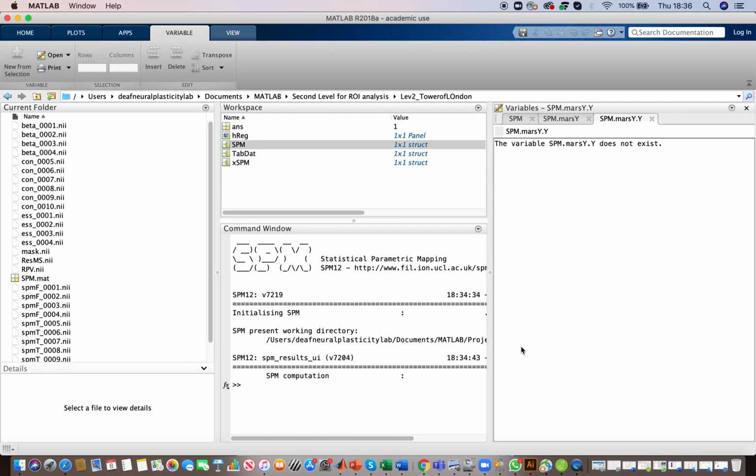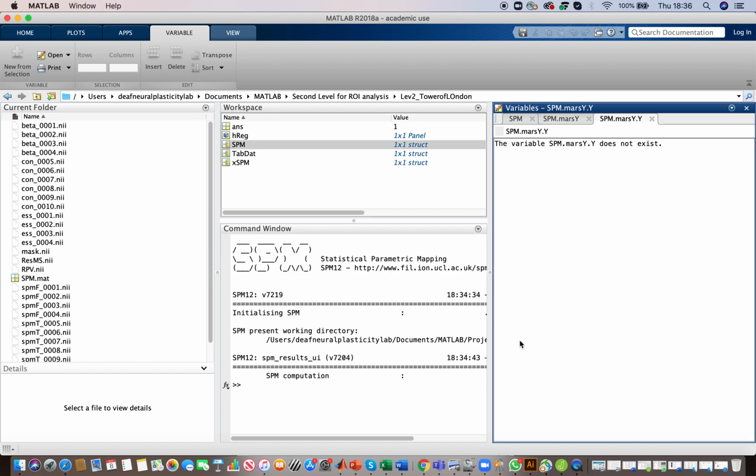And that's pretty much it. Once you get your matrix, you can just copy and paste it into an Excel spreadsheet, name the variables, name each row with your participant name, and just run the ANOVA test on SPSS or JASP or whatever program you like.